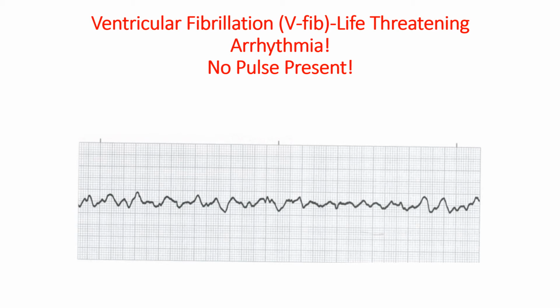The sooner you defibrillate, the better chance you have to convert somebody. New onset V-fib is usually coarse, especially if the arrest is a primary cardiac event versus a patient who has been dying with corresponding hypoxia or acidosis. Normally they respond very well to defibrillation if you catch V-fib and defibrillate very quickly, as well as giving CPR.